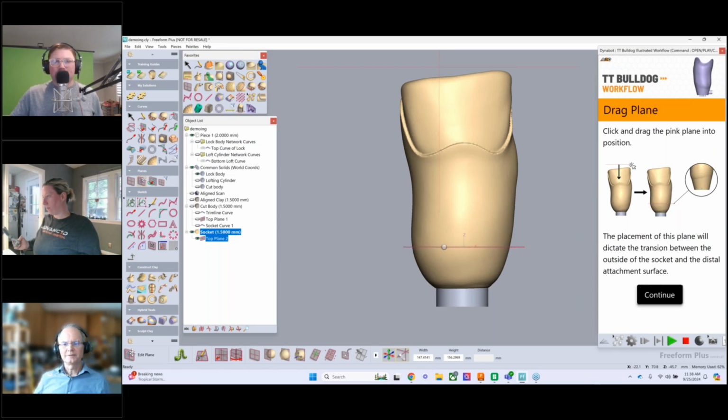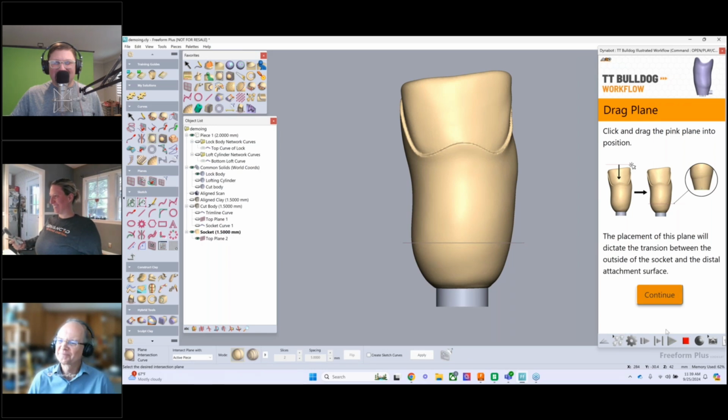So. Quick question. Whenever you've done those offsets, whether you go inwards or outwards, have you ever seen one that's failed? Not on that, no. There's a leading question for the CAD guys out there who are used to using B-reps and crazy models, organic models like this when they do shelling. They'll know what I'm talking about.